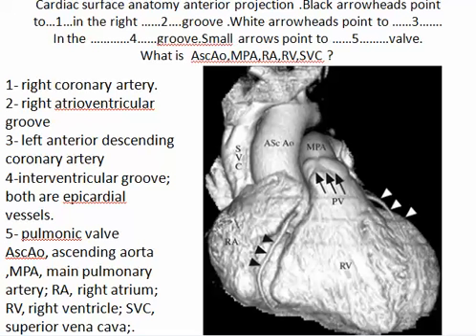Small arrows are pointing to number 5. This is the pulmonic valve, the valve for the pulmonary artery. So the part appearing above this is the main pulmonary artery. And of course we know ascending aorta, main pulmonary artery, superior vena cava, right ventricle, right atrium, and so on.